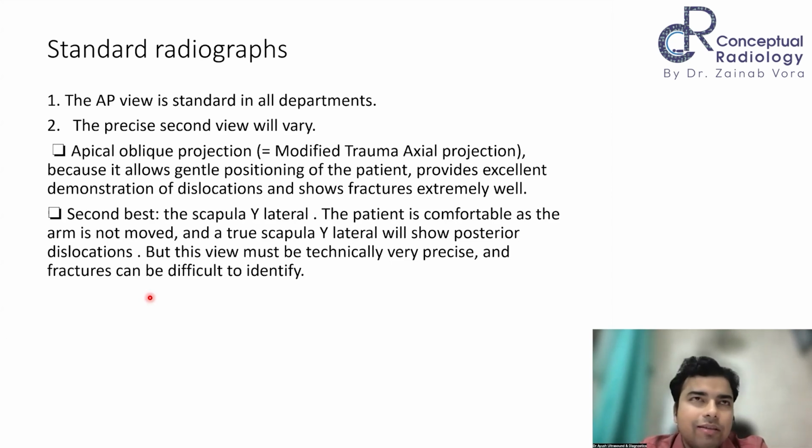But this view shows the fractures very poorly, and it needs to be technically very precise. Otherwise, there could be some misjudgments.